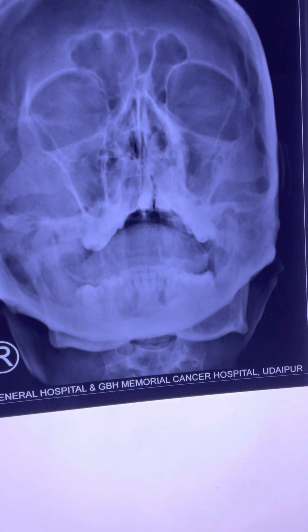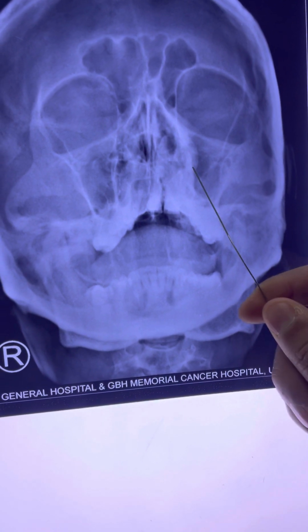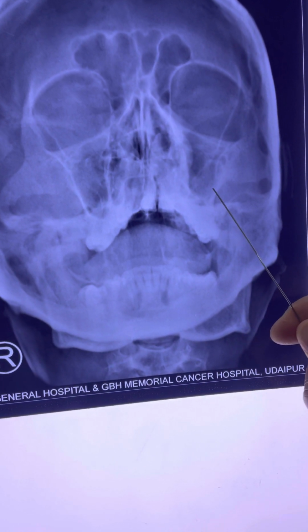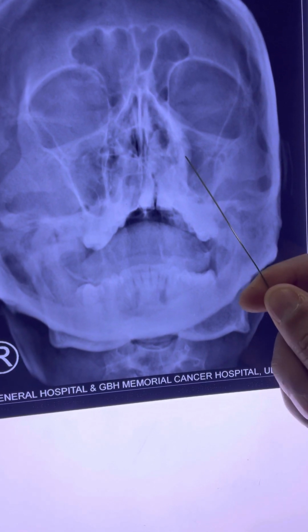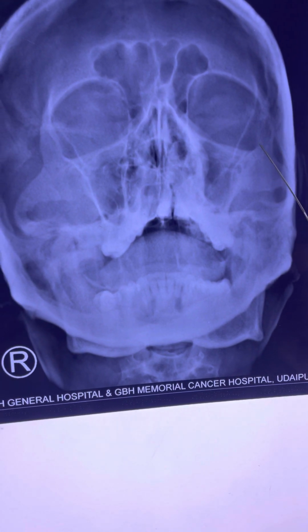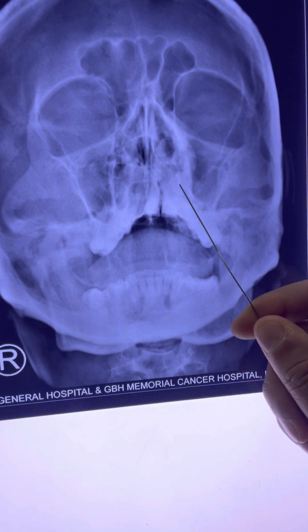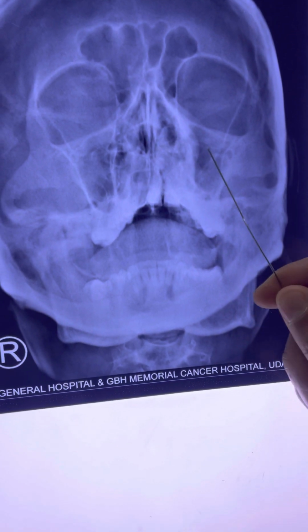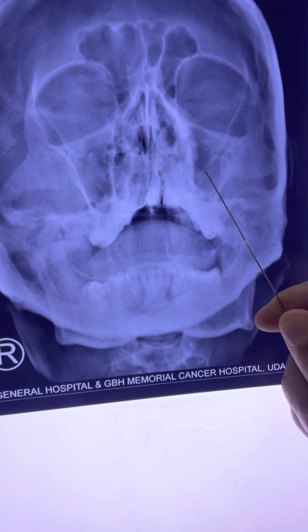One way how we can differentiate between acute and chronic is that if there is acute collection of the mucus or the pus in the maxillary sinus, then there will be fluid, and fluid will have concavity above it. If there is a polyp, it's a chronic condition, and there's a polyp in the maxillary sinus, then in that case there will be convexity in the maxillary sinus.